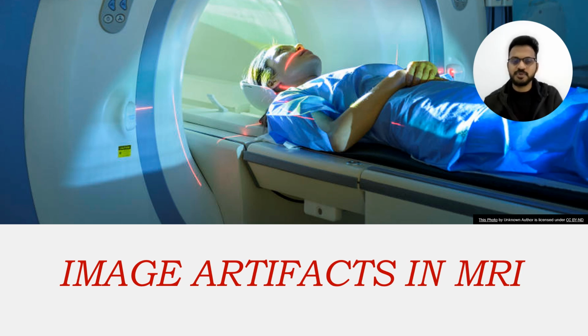Hi everyone. Today I'm going to discuss some image artifacts in the MRI. We know that image artifacts in the MRI are unwanted data or signal occurring during the imaging procedure. Today I'm going to discuss some of the imaging artifacts in the MRI.